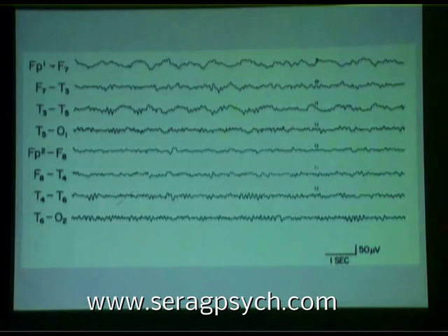Okay. By the way, if you're reading an EEG in the outpatient department, and you see a delta looking like this, which gradually disappears, you know what happened. The patient had a seizure while the technologist was preparing the EEG, okay? And maybe the technologist didn't notice that the patient was sitting there going, or something like that. So if you ever see a delta activity while you're reading an EEG that gradually disappears, that's probably a postictal delta. It's not a transient ischemic attack or something.